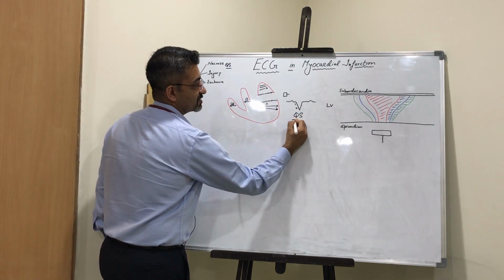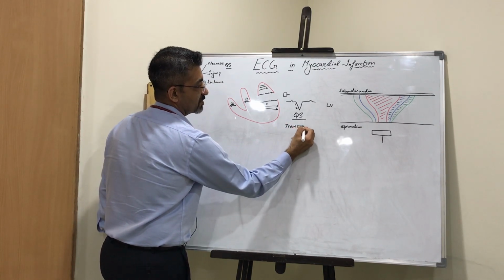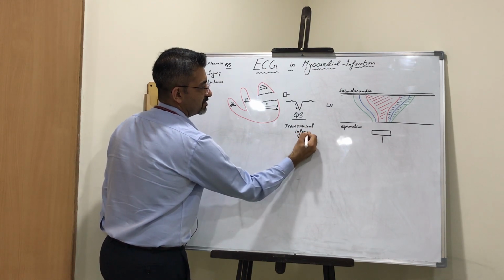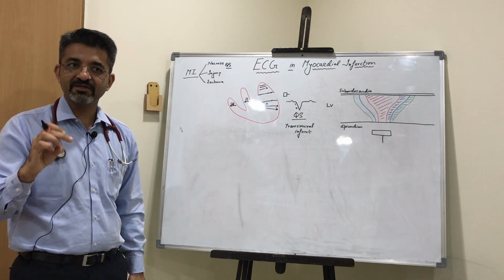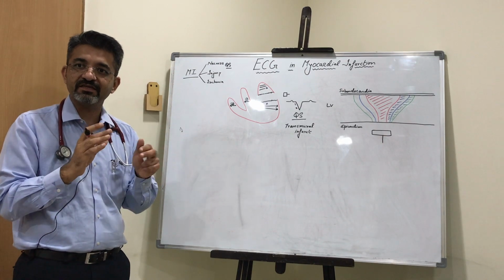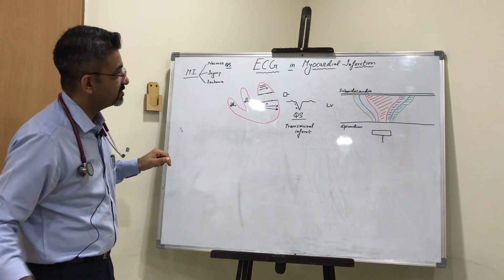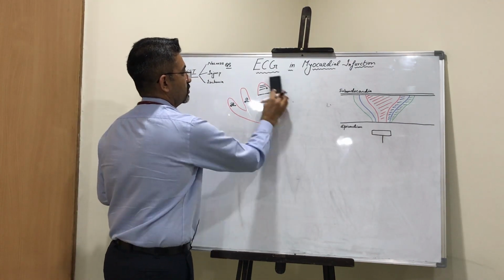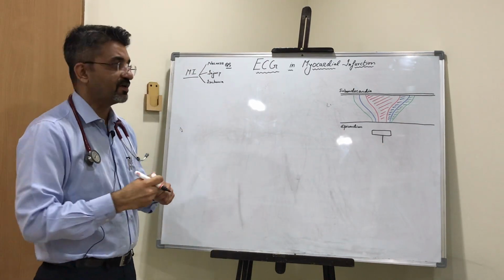So what is QS? It is a complete transmural infarct. So whenever in any lead we encounter a QS, capital Q, capital S, it means below that lead we have an area which is transmurally infarcted. Now there can be a situation where there is no transmural infarction.